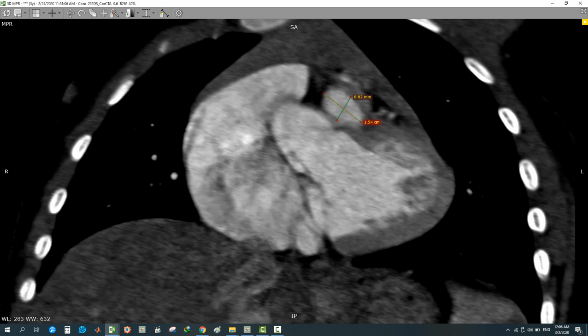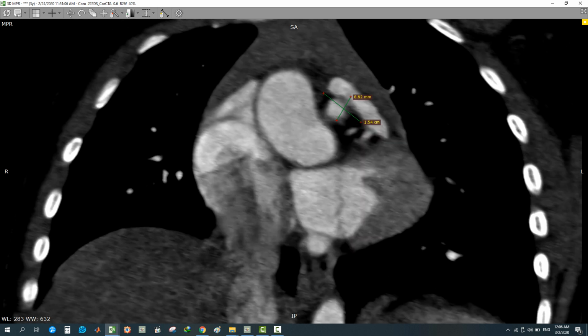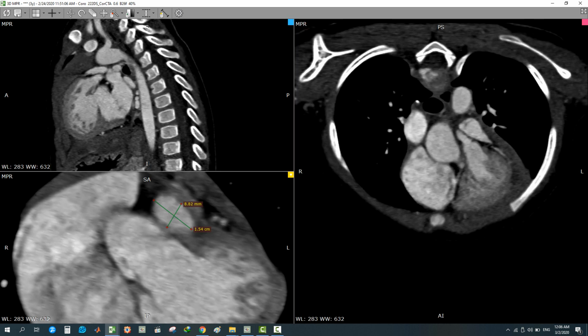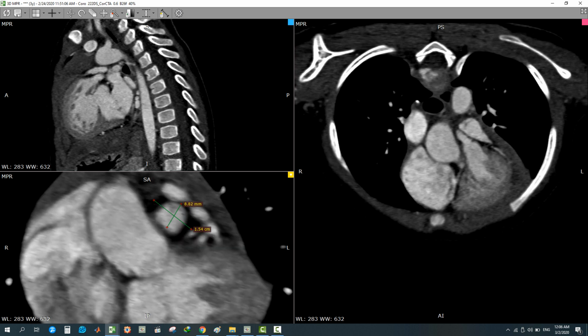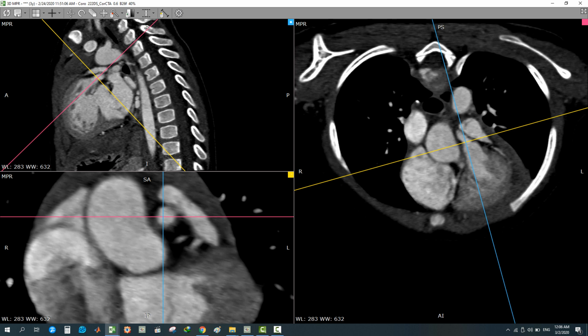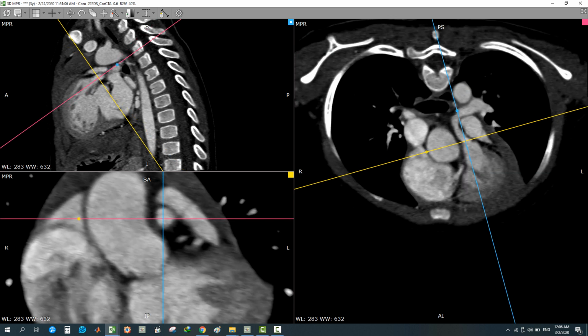15 by 9 millimeters. You can scroll here. If the pulmonary valve leaflets are thickened, it will be shown here, but I don't think so. Just the MPA, the main pulmonary artery, is markedly attenuated. You can measure it in systole in this way.